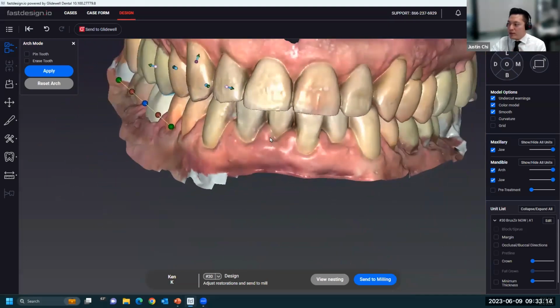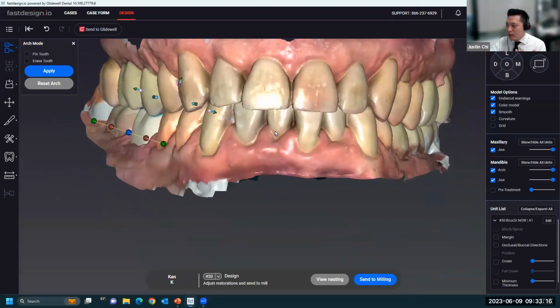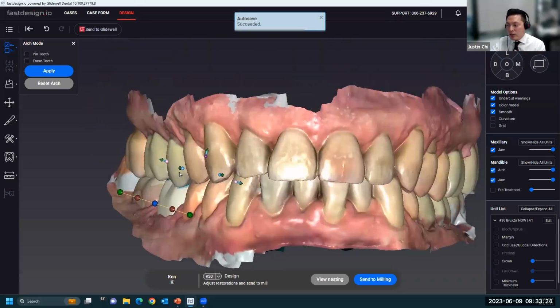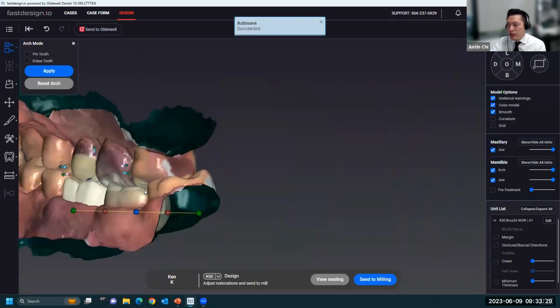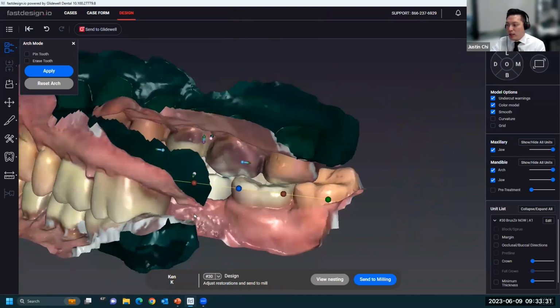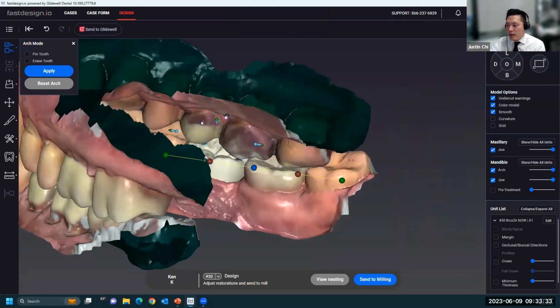We can see on the opposite side, this is normal occlusion, great cusp-fossa relationship with the buccal cusp tips being the functional cusp and position in the central fossa of the opposing. Let's look at it from the lingual, just so you can see that from this view here. I may cut away the other side of the arch.